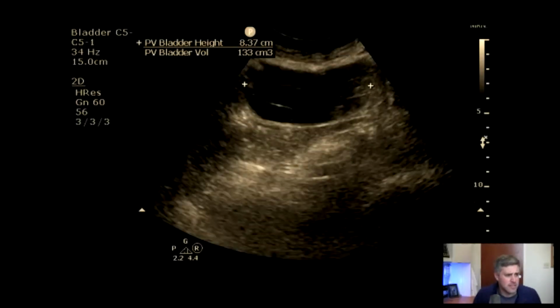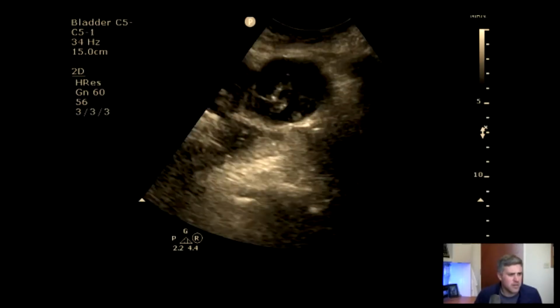And so let's just, I don't know, we can pick any type of patient demographic. So we'll say a 50-year-old female patient coming in with abdominal pain and vomiting, right? They say their pain's mostly in the lower abdomen. So you scan and you get this, right? So here's an 8 centimeter transverse oriented structure. We go on the other orientation. You have sagittal orientation. There's no measurements here, but it's an anechoic structure. Whoop, there's anechoic structure. It must be the bladder. We're kind of down in the pelvis. All is good, and let's call it there, right?